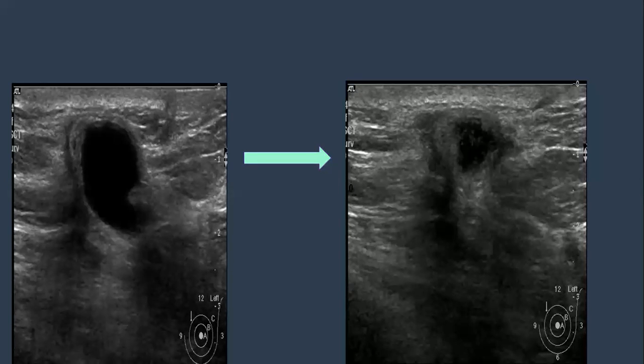So representing the residual mass confirmed on ultrasound. Why the residual mass is regressing? Malignant mass is getting small. Chronic hematoma or seroma. Yes, it's a chronic hematoma or seroma.